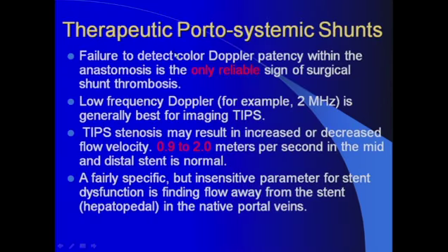All right, so now we are going to talk about therapeutic portosystemic shunts in these patients with cirrhotic changes. We evaluate those portosystemic shunts every now and then to make sure that they are patent and functioning. The most important thing that you need to keep in mind is to try to avoid evaluating these shunts immediately after being put in.